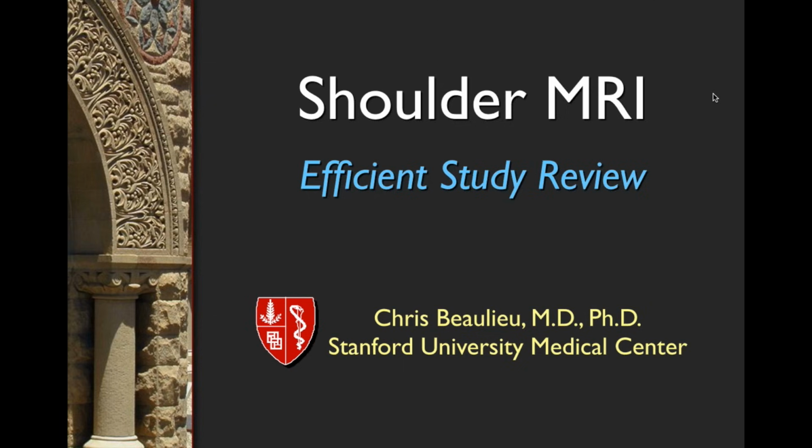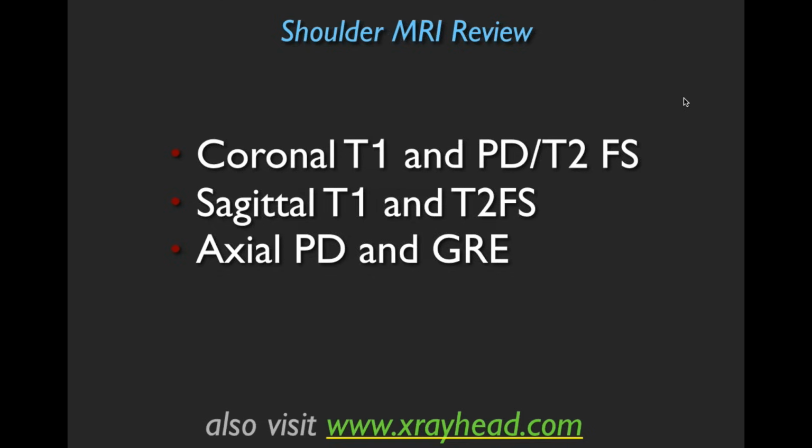In this video, I'd like to go through my approach to shoulder MRI, an approach that I think is efficient as well as thorough. What we'll do is go through the different pulse sequences that we do in the typical order that I look at them.